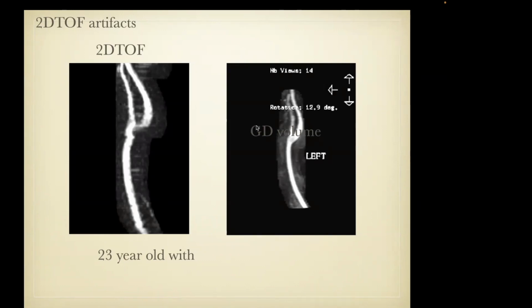But when we look at the gadolinium volume image of the same patient displayed here, you'll notice that the internal carotid artery looks completely normal. So how do we reconcile these two images? Obviously, one of them is incorrect. And so once you recognize that in the carotid bulb, in a young patient, you would expect to have an expanded carotid bulb, as you see here.